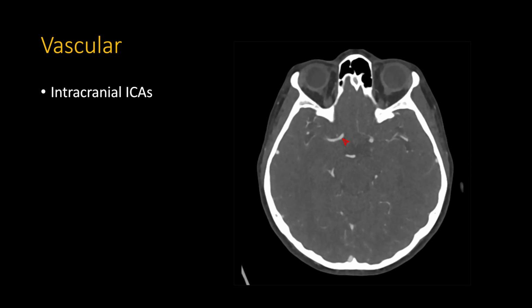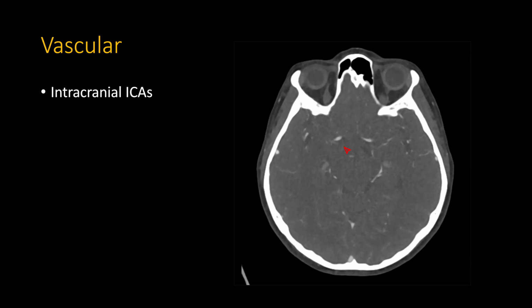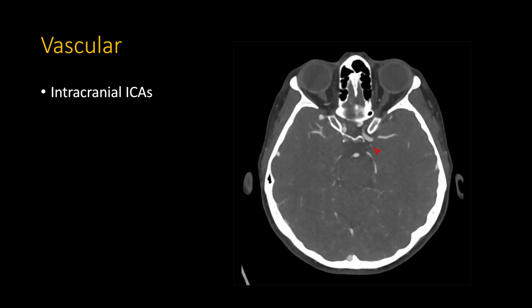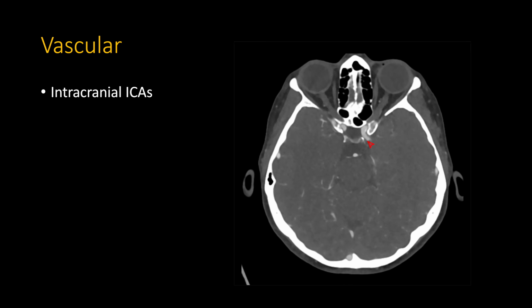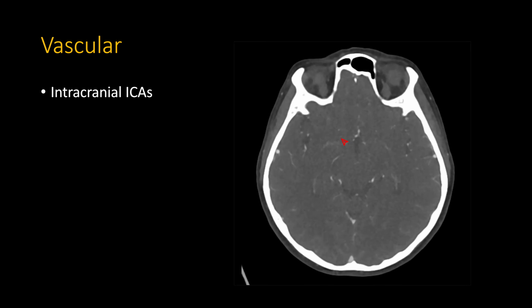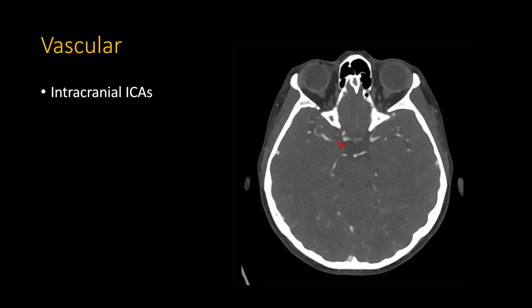it's the ophthalmic segment. Once the posterior communicating artery comes off, which on this side I have a very hard time finding, it's probably just not even there, but it will be somewhere around here, surmising from where it was on the other side. So here's the posterior communicating artery somewhere right here. You would come from the ophthalmic segment to the communicating segment. So from the posterior communicating artery to the carotid bifurcation becomes the communicating segment of the ICA.